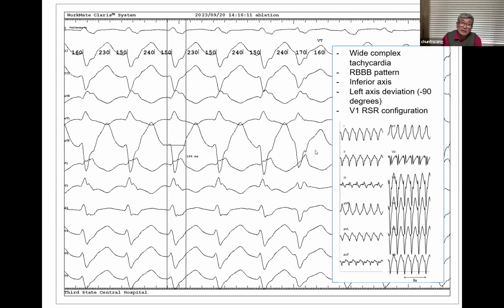Is that expected in fascicular VT? What is the typical QRS duration of fascicular VT, Saro? It's from 140 to 160. No, it's 120 until 160. Typically, you would expect to see less than a bundle branch block, right? Yes. It might be mixed with the papillary muscles. Your patient's QRS is too wide to say this is a fascicular VT. Yeah, that's number one. Okay.